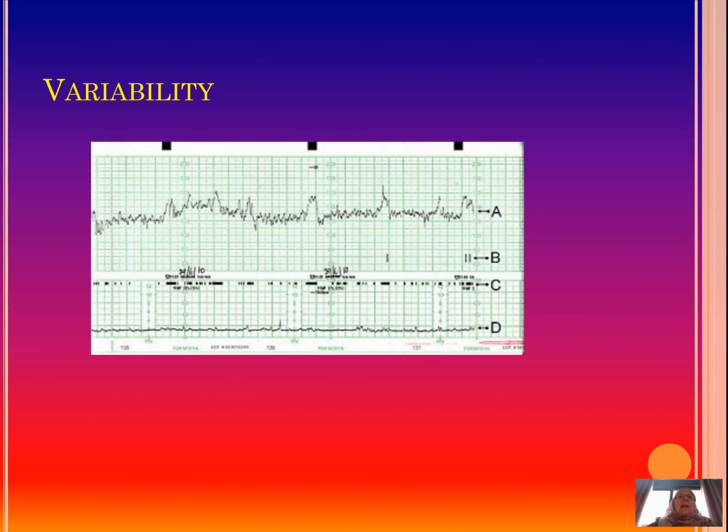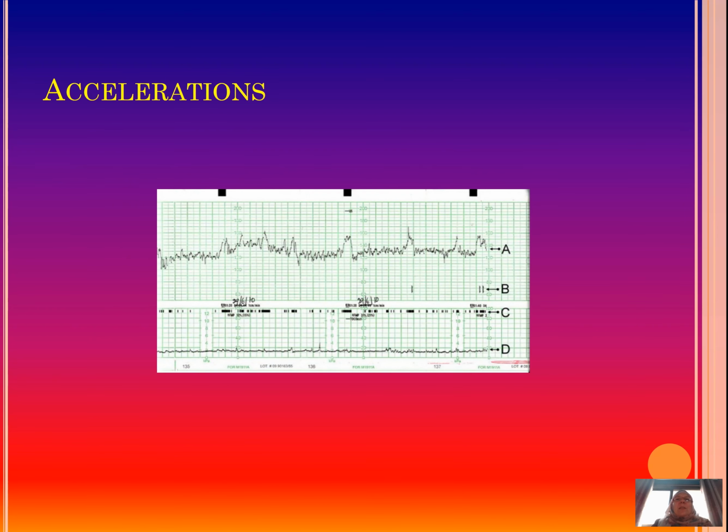Here you can see accelerations on the CTG. In the middle of the CTG you can see a fine looking acceleration, followed about 4 minutes later by another one, and then 5 minutes later by another one. These are very good features.